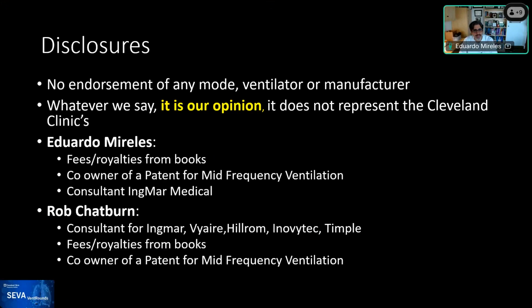That's why it takes a long time to get to zero. So it's not the ventilator's fault, right? The ventilator can't be faulted until the flow crosses zero. And then if it takes time, then the sensitivity isn't set right. Well, without a doubt, but if you have this patient on NAVA, that's true too.